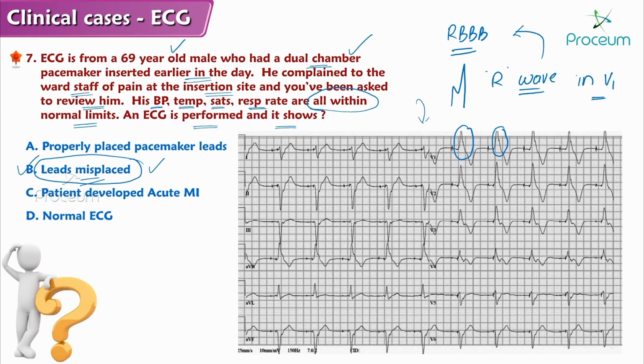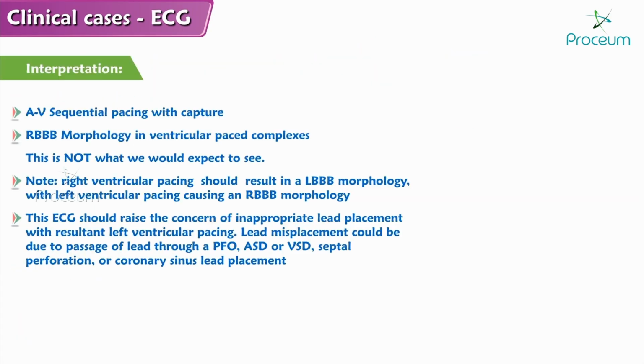And another important point to tell you that this is the ECG of a pacemaker is, you have a vertical line just before the QRS complex. You can observe one small vertical line before each and every QRS complex. That is the pacemaker rhythm which is originating within the right atrium. So the presence of small vertical line before the QRS complex tells you that the patient is on the pacemaker. Alright. Now, after having discussed this particular clinical ECG, we will move on to the next one.